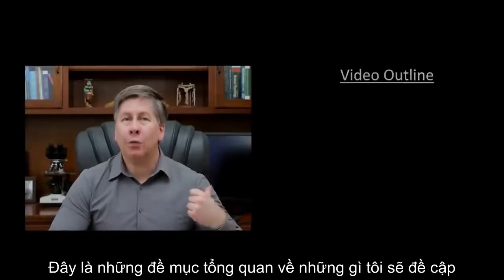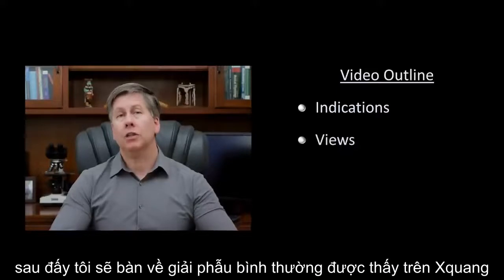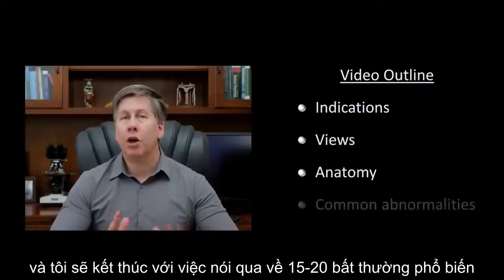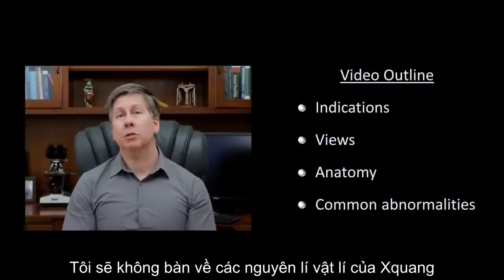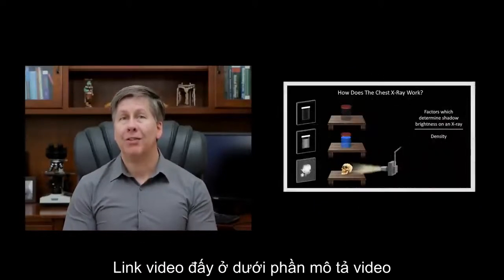Here's a general outline of what I'll be covering. I'll start with their indications, followed by typical views. Then I'll discuss normal anatomy as seen on X-ray, and I'll end by reviewing 15 to 20 common abnormalities which any clinician should feel comfortable identifying. I will not be discussing the general physics principles of radiographs as they're covered in my first video on my chest X-ray series. A link to that is in this video's description.